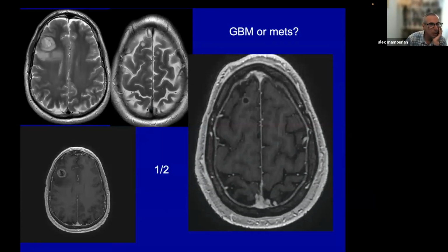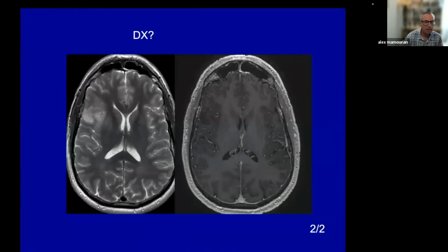Okay, this is another patient that has multiple lesions. This one's ring enhancement. This one's kind of rim enhancement. And I think you might consider the possibility here of metastatic disease. Oftentimes I see cases like this get reported out as could be multicentric glioma, could be metastatic disease. But I want to show you something that I don't think is widely known, but I think can be very helpful. You'll notice that the cortex is abnormal here.